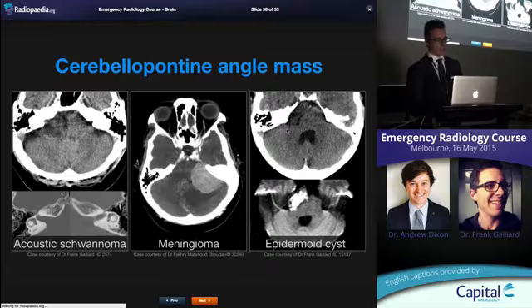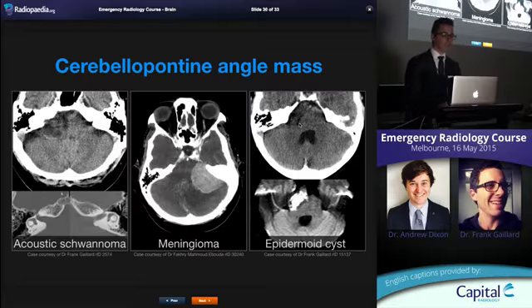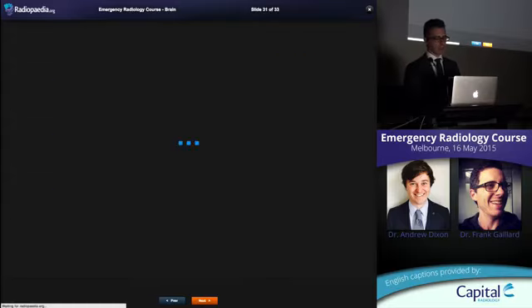And epidermoid cyst. Now these two look very similar. Epidermoid cyst in older scanners, and even sometimes on modern scanners, can be hard to see on CT because they're almost CSF intensity. They're just desquamated squamous epithelium. On MR, DWI is again your friend. They vividly demonstrate high signal on DWI. Nothing else will really do that in this differential, so you can make that diagnosis easily.